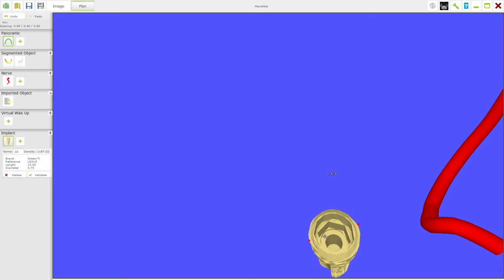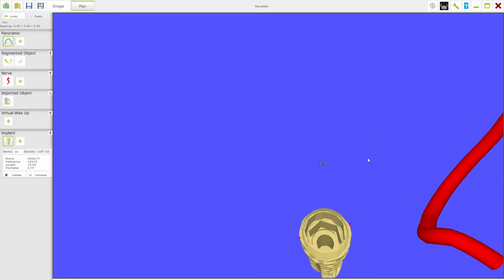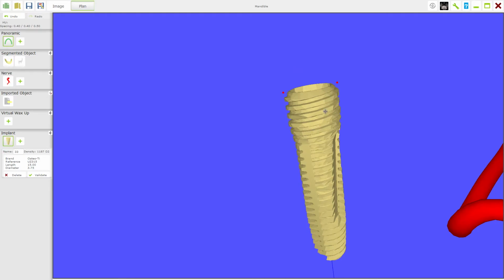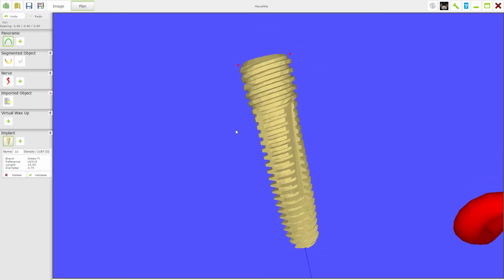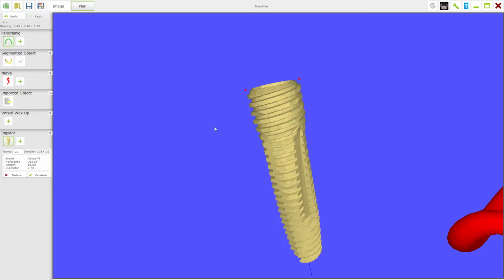Now this is important because later on we'll be looking at ways of restoring implants three-dimensionally to make it even easier for you, but for now just remember that these drawings are not just a sketch, an artist's representation. This is three-dimensional modeling. If you had a digital printer and fed this image to it, you could produce a replica of the implant in plastic, or if you had a printer that printed in metal, it could print it in metal, and you can scale it up and scale it down, and that printer would also print the internals, the hex and the post hole. So all that is there, and obviously later on when you come to place abutments, you'll need that kind of information in your planning software, or your technicians will if they're using it. You can see the nice cutting taps and the shapes of that, and this is a three-dimensional rendering.